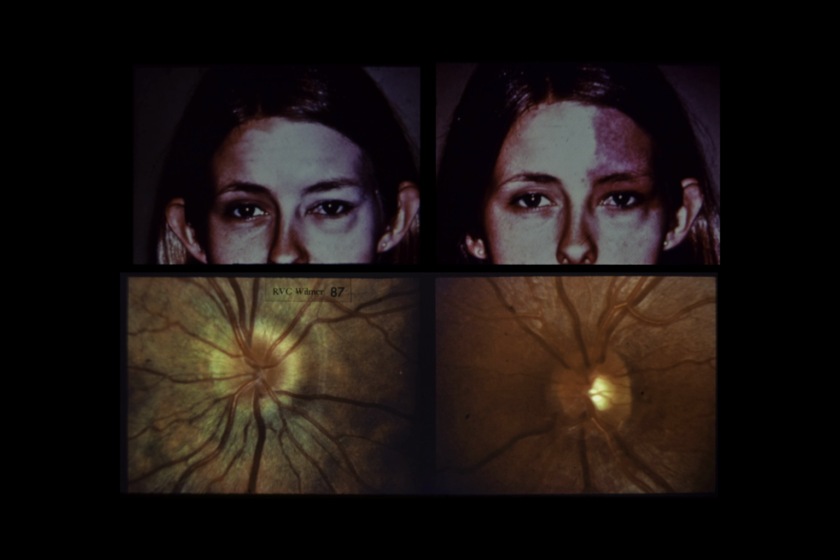In another patient with encephalotrigeminal angiomatosis, the eye examination was normal except for the posterior pole of both eyes. The right optic disc is mildly elevated with a blurred margin and central hyperemia. A fluorescein angiogram demonstrated no disc leakage. The left optic disc is flat, with a normal central cup. The circumpapillary region has a uniformly dusky red appearance.